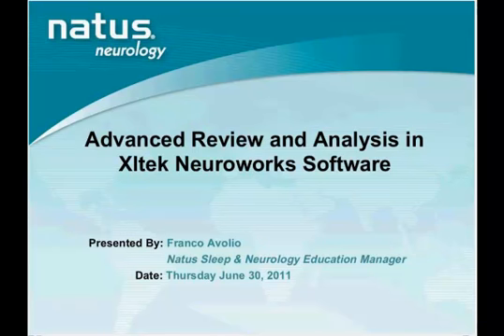study into an Excel file, and I'll end the session talking about the ICU touchscreen option that is available in NeuroWorks. And I have a video that I want to share with you at the end, which simply demonstrates the touchscreen option that is available.